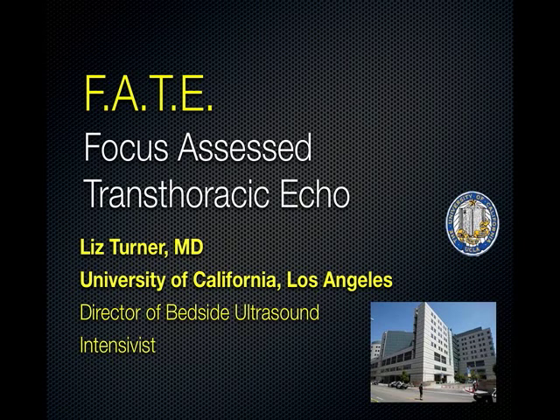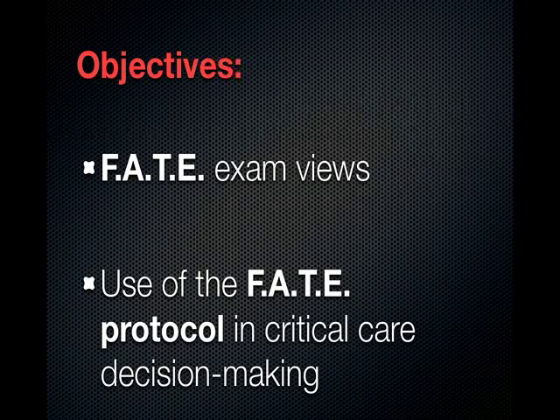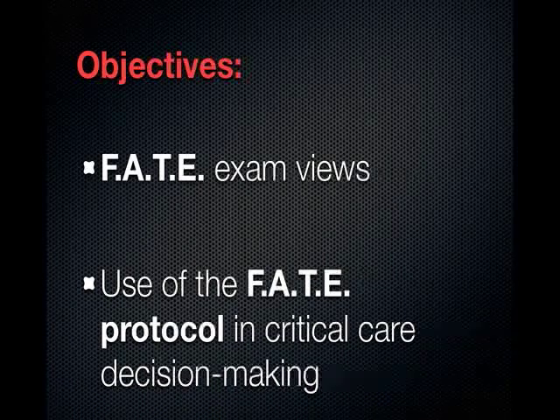This talk will focus on the Focused Assessed Transthoracic Echo. This is a point-of-care application that primarily looks at cardiac function. Today we're going to talk about the FATE exam views. These are the three major cardiac views. And we'll also talk about how we incorporate the FATE protocol into our decision-making in both critical care and hospitalized patients.